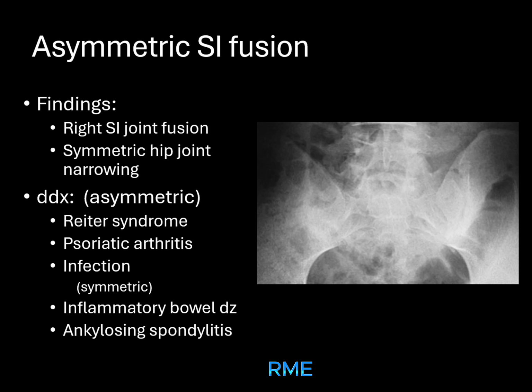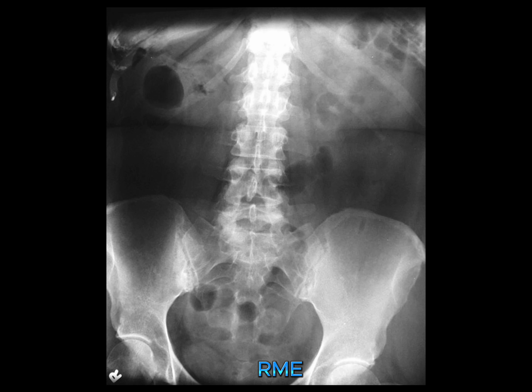Management involves anti-inflammatory medications and treating the underlying cause, such as antibiotics for infection or DMARDs for inflammatory conditions. Let's move to the next case. What do you see in this image?